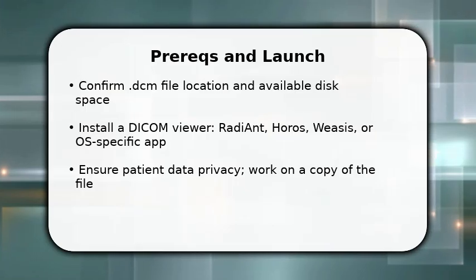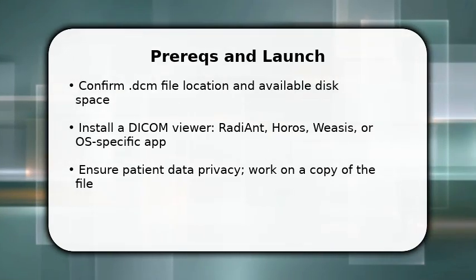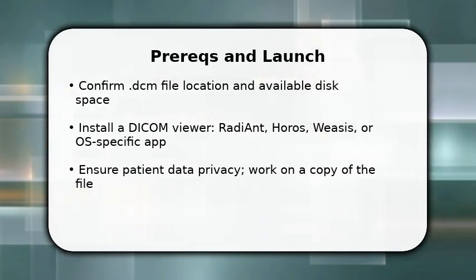Enjoy the video. You already have the DCM file and a viewer ready. First, make a copy in a convenient folder so you preserve the original. Next, open your chosen DICOM viewer.